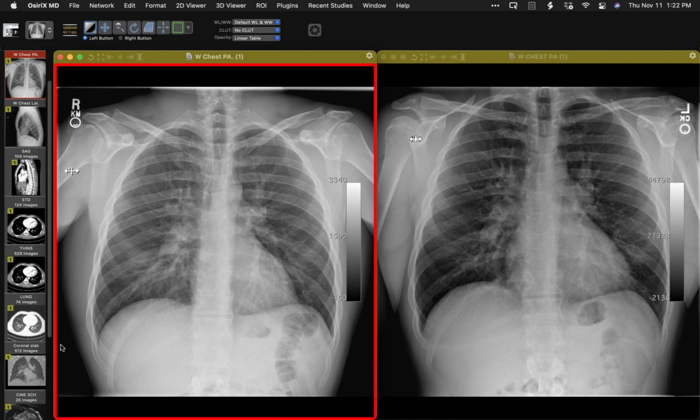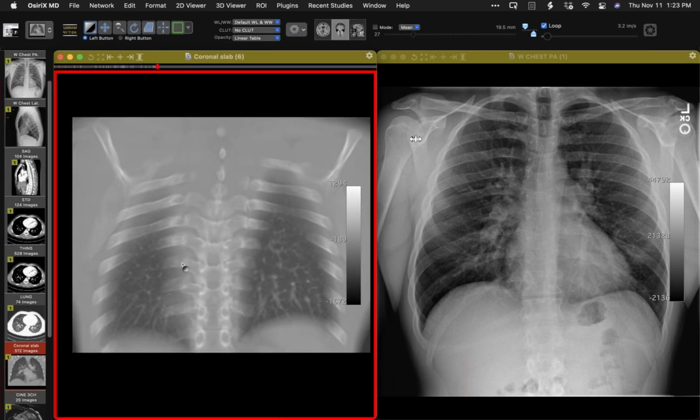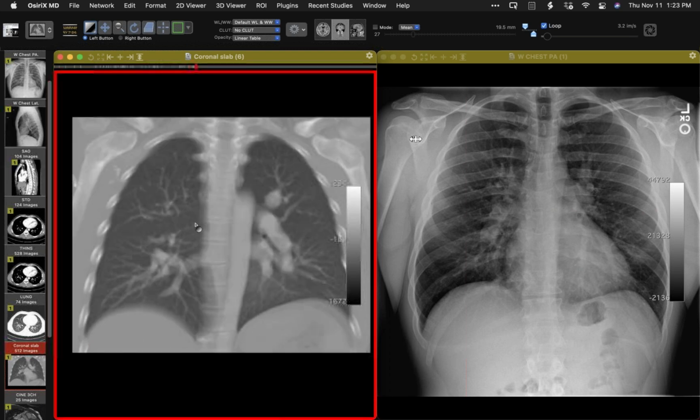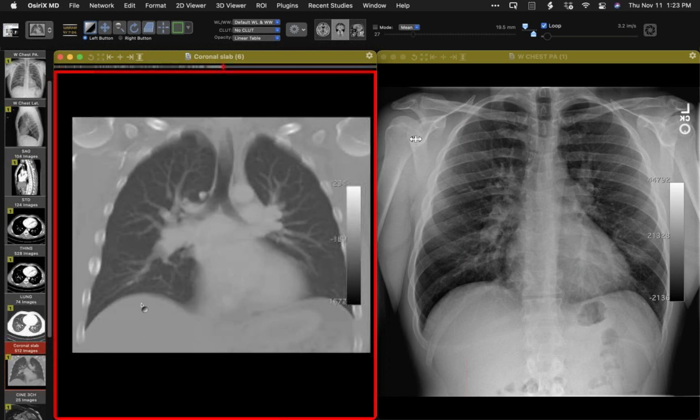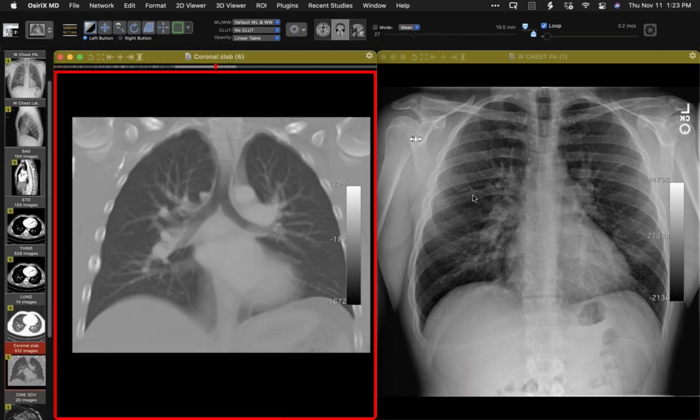So let me now bring in this. This I made from a CT, of course. So this is July, this is the radiograph from November. And appreciate that we have distended vessels. And in starting to look at that, if you see two vessels parallel to each other up here, typically the artery is medial, the vein is more lateral, but of course there's a lot of overlap and that isn't always easy to perceive by any means.